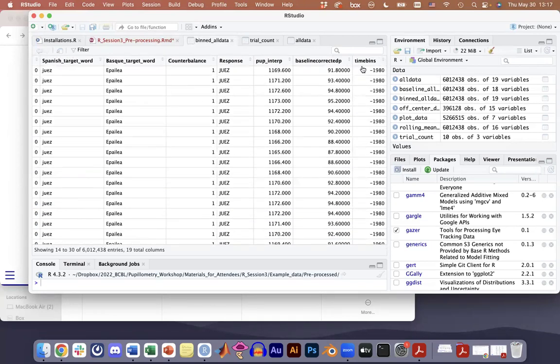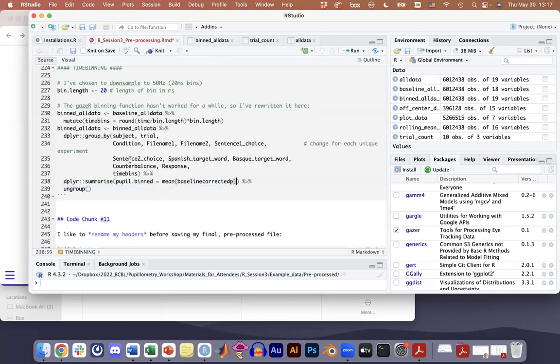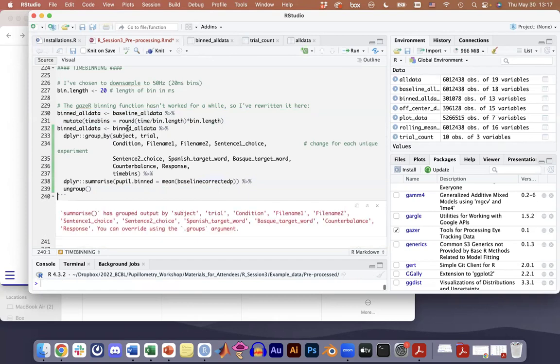Yeah, so the first step is to add this on the right, and then the second step is to actually recombine the data. Oh, you know what I bet it is? Hold on. Yeah, okay, so I tried at the last minute to add the X and Y's for people, and I think I did it wrong.